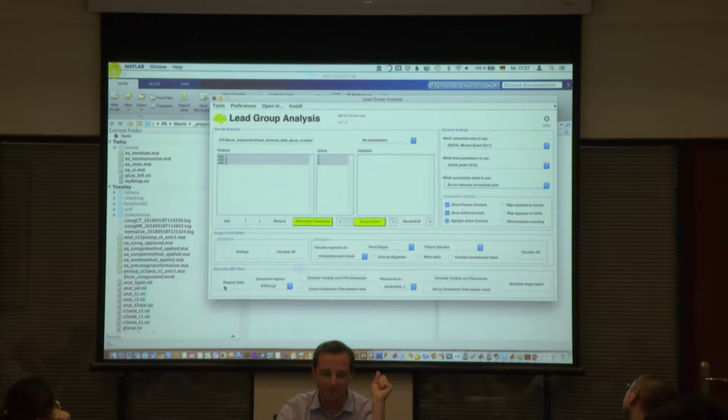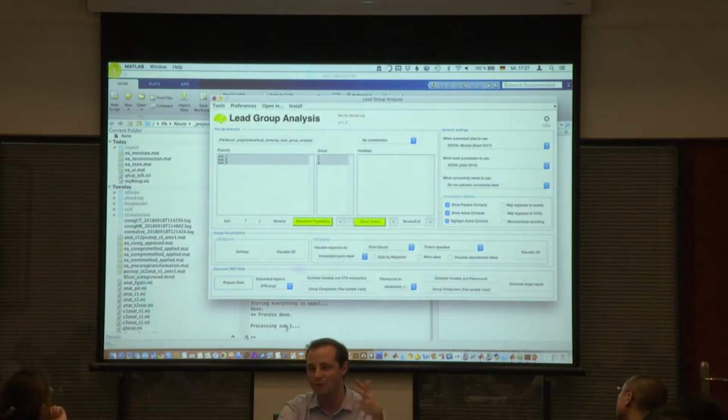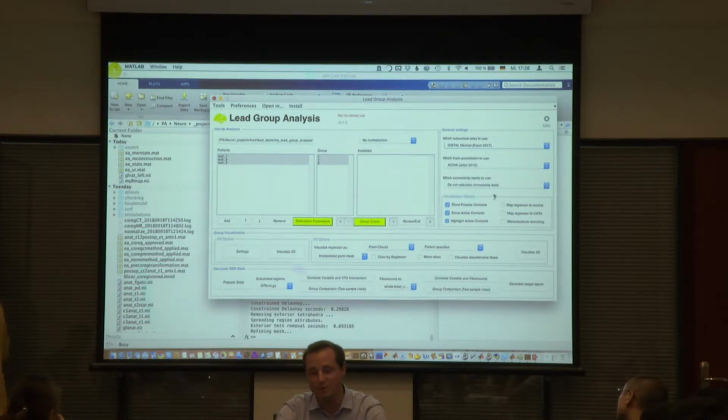And then you say prepare DBS stats. That means it will basically open each patient and in the background create VTAs. And these will then all be stored, and you can then use them to calculate stats. It doesn't only do VTAs, but it also gives you the possibility to calculate overlaps between the VTA and subcortical regions defined by this atlas. And then if you would use connectivity, it will also give you fiber counts to specific regions.